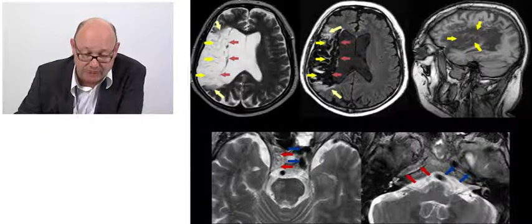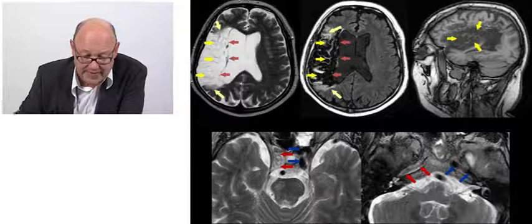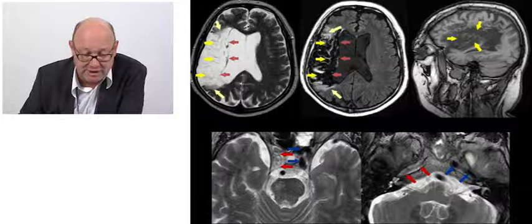There is secondary enlargement of the right lateral ventricle. The tissue loss has more or less the same signal intensity as the CSF. There's an area of gliosis in the periphery of the lesion. We have ipsilateral ventricular dilatation. This is an old infarction.